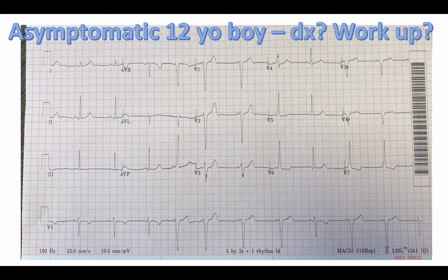I might be saying it wrong. That they're intermittently pre-excited. You would be saying it 100% correctly. That is exactly how we would say it. So this patient is intermittently pre-excited, and amazingly, on the same tracing, we're seeing it coming and going.